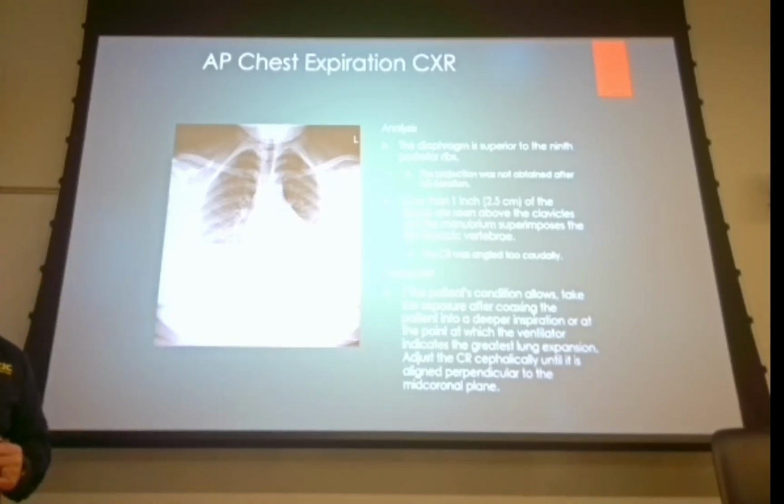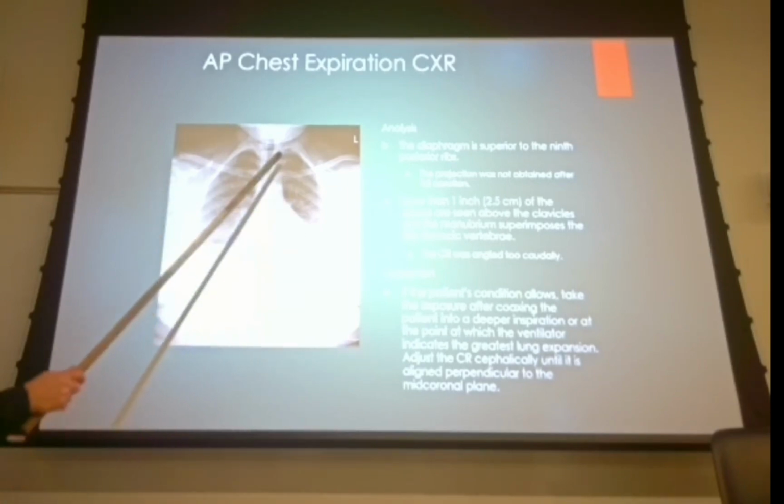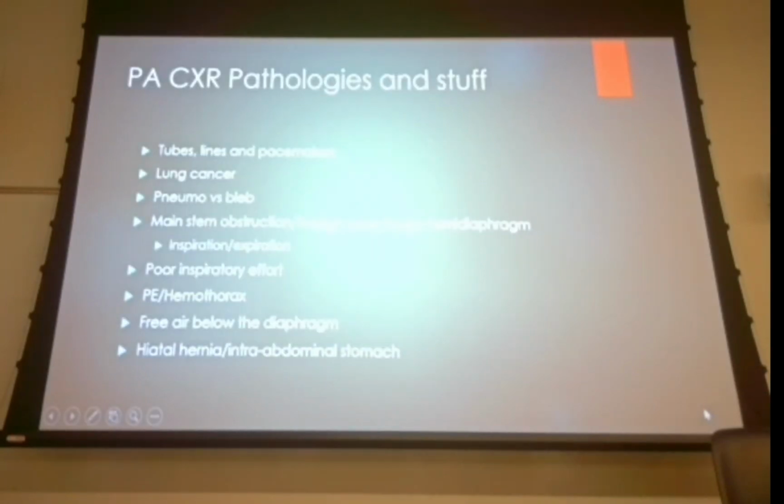Diaphragmatic paralysis, we may do a sniff test or something under fluoroscopy. But for inspiration, expiration chest x-rays, those are your two go-to answers on a test. Now, is that what we're looking for here? I don't know. The textbook just says it's expiration chest x-ray, which it looks like it is. We've got 1, 2, 3, 4, 5, 6, 7, 8 posterior ribs. So if that patient exhaled before you made your exposure, that's probably a good reason for a repeat.